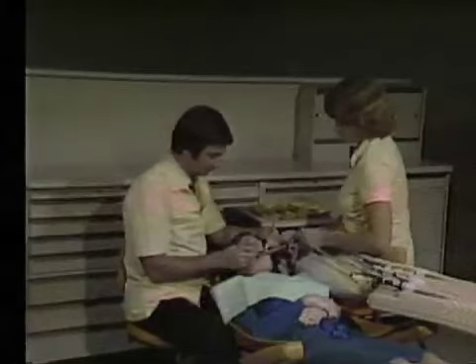The dental assistance zone is located between the 2 and 4 o'clock position. Generally, the dental assistant is seated in the 3 o'clock position and remains in this position for all areas of the oral cavity. In this location, the assistant has access to the unit, instruments, and supplies. The static zone is an excellent location for the assistant's mobile cart. This places instruments and materials within easy reach of the assistant.